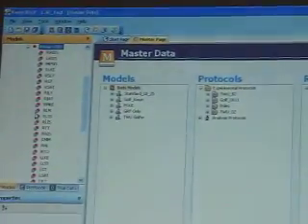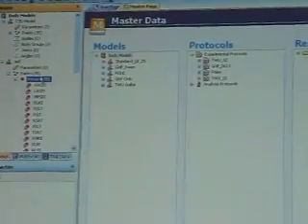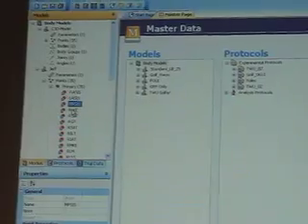That's okay if you want to use a different name. So you load it into a C3D file and then you copy and paste it to another file. You can always copy and paste the model. Basically it's creating a copy. But here, if you want to change the point names, that's okay. You will not be able to switch the sequence.